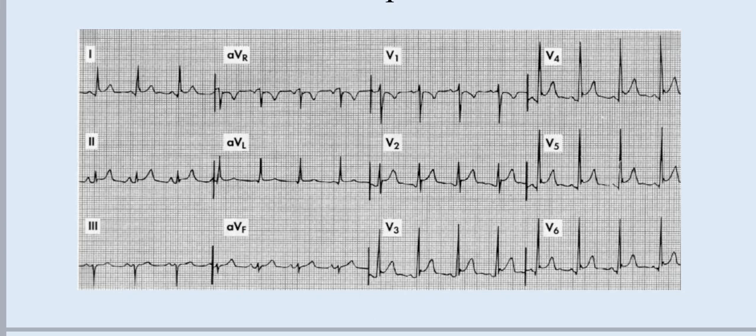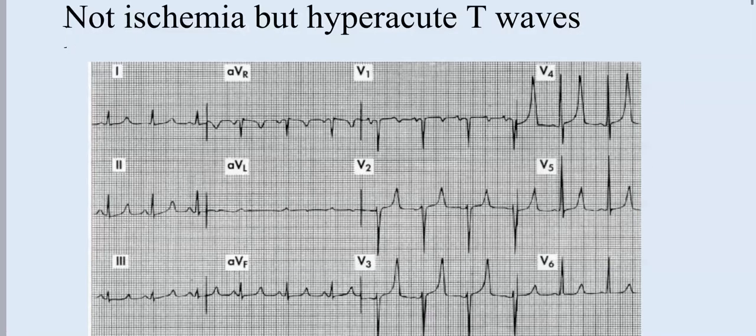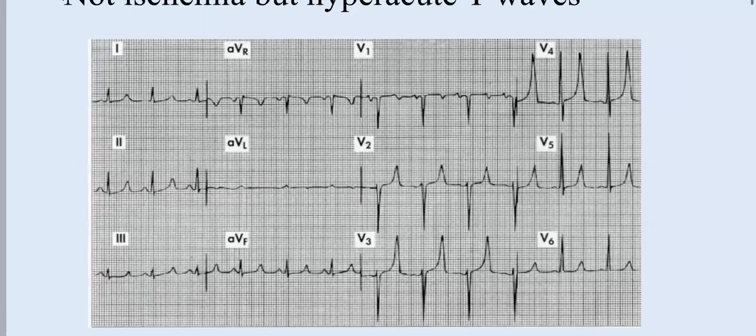Okay, now what is this? Now I see a T wave that looks like a hyperacute T wave, and I think of ischemia, because ischemia, especially the STEMI track, starts with a hyperacute T wave. So is this the hyperacute T wave of ischemia, or are we talking about something else? Hyperkalemia. This is hyperkalemia, exactly.